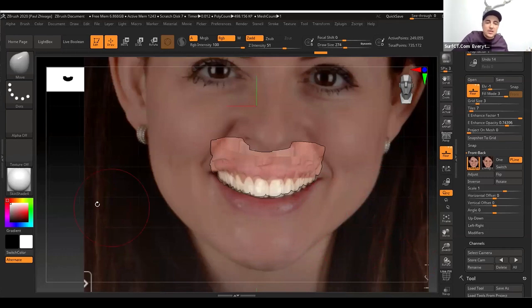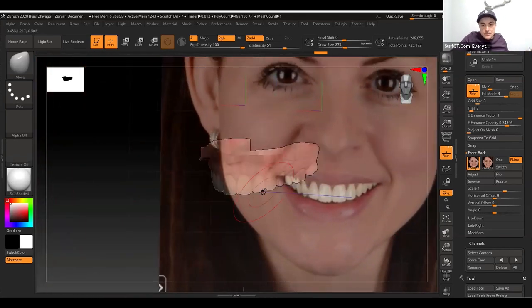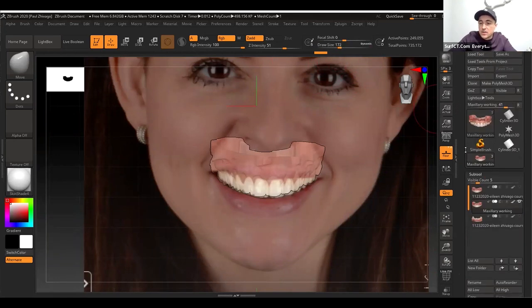So I can now start working to modify the teeth the regular way how we did it with the move brush. Just starting to take our working cast. So just make sure that the maxilla are working, and you can start to move these teeth in the position that you showed the patient prior based on the design.